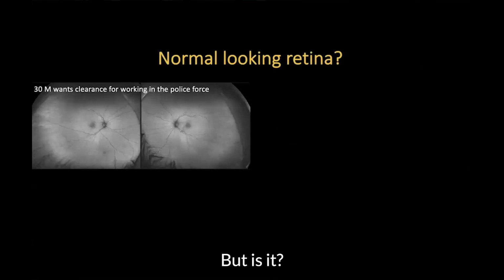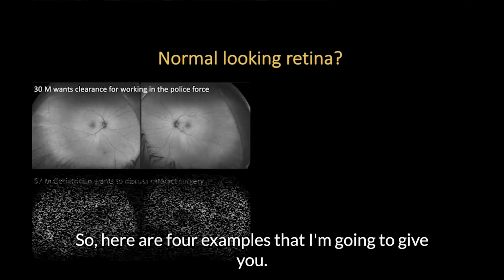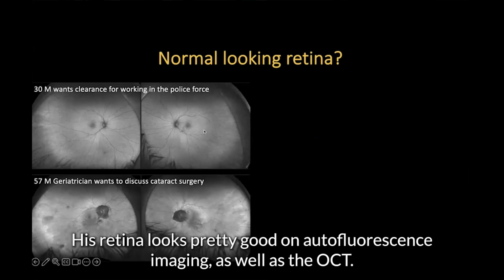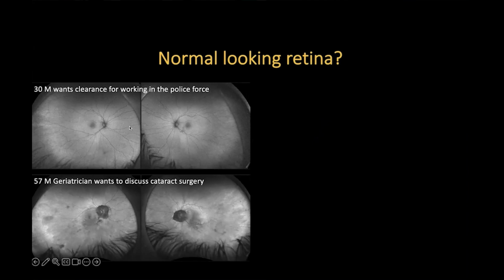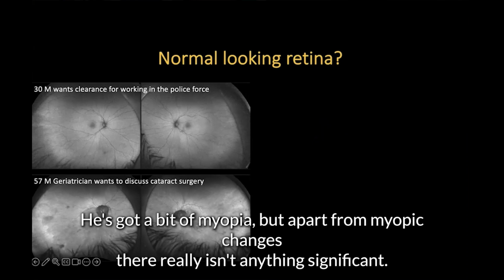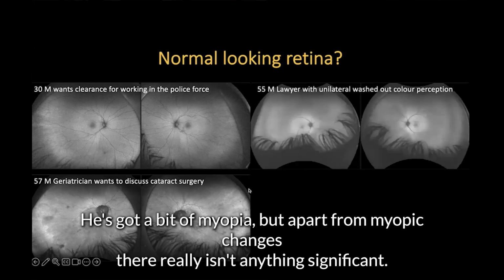But is it? So here are 4 examples I'm going to give you. First is a 30-year-old man who wants clearance to work in the police force. His retina looks pretty good on autofluorescence imaging as well as the OCT. Another patient, a 57-year-old geriatrician, who wants to discuss cataract surgery. He's got a bit of myopia, but apart from myopic changes, there isn't really anything significant.